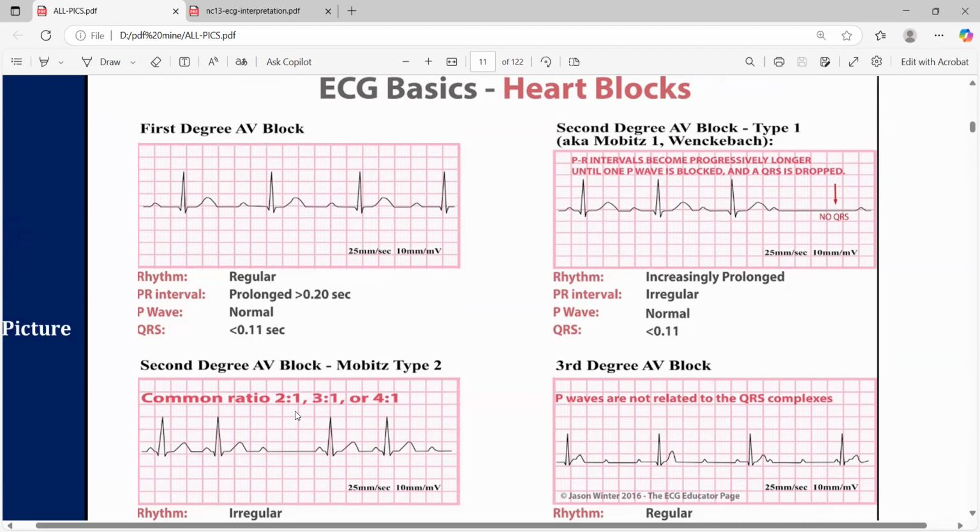You will be able to figure out, because they will give you a long strip, or at least you will be able to tell whether after 2 or 3 there is a gap. If after 2 or 3 there are more gaps, then this is type 2, and if there is less gap, then this is basically type 1. Okay.